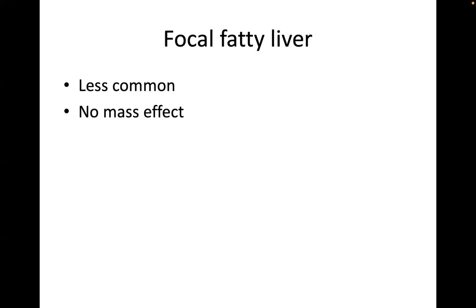Focal fatty infiltration of the liver is less common. You find that there is no mass effect. It is something that we see when we do imaging, but it might be due to the blood flow into the liver, the venous flow into the liver, or the distribution of the fat globules in the liver. That's why you do get a differential uptake of contrast, resulting in showing us these lesions.